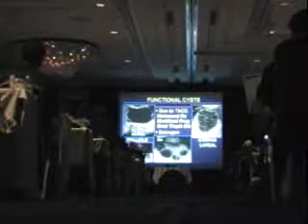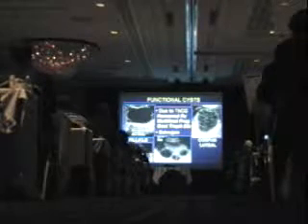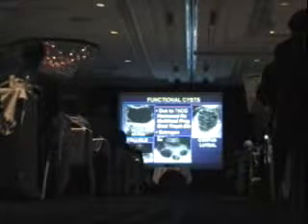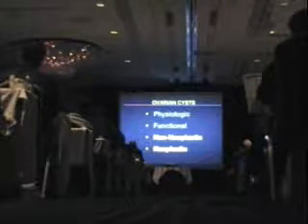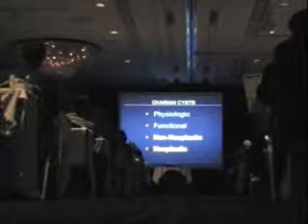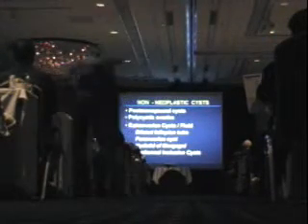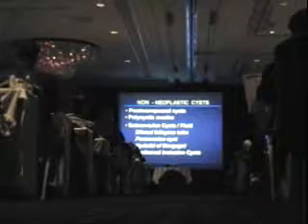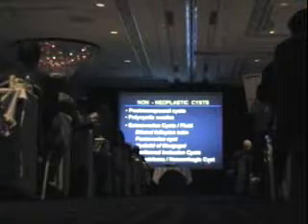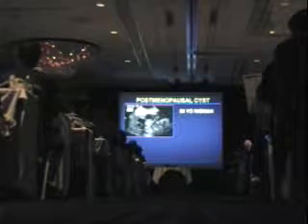Don't forget to look around the neighborhood for ascites, pleural effusion, and pericardial effusion with hyperstimulation syndrome. Usually these cysts are very large, approaching perhaps 10 centimeters in size. Now, ovarian cysts or other conditions around the neighborhood: a lot of non-neoplastic conditions, and finally neoplastic conditions. You may have postmenopausal cysts, you may have polycystic ovaries, you may have things outside the ovary that can mimic the ovary, and of course you may have hemorrhagic conditions, endometriomas, or hemorrhagic cysts such as you would see with a hemorrhagic corpus luteum.